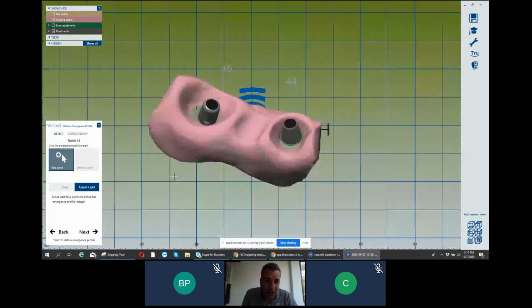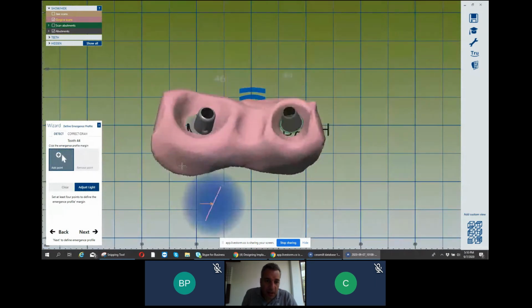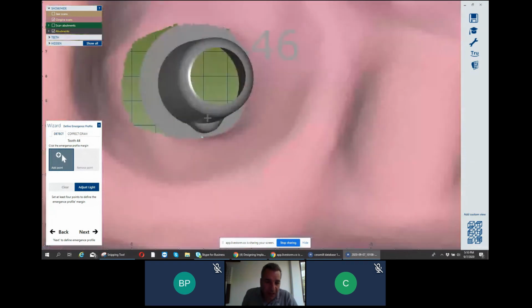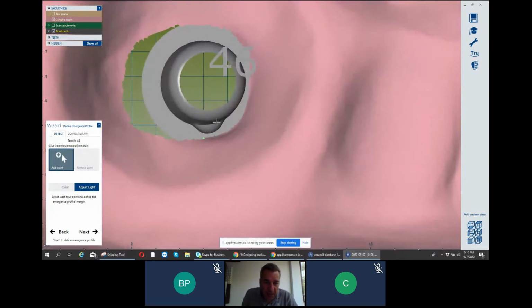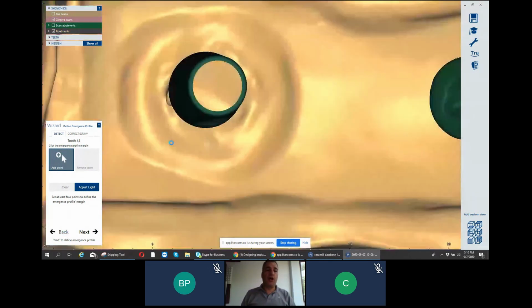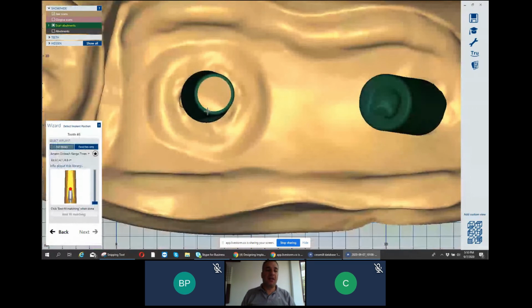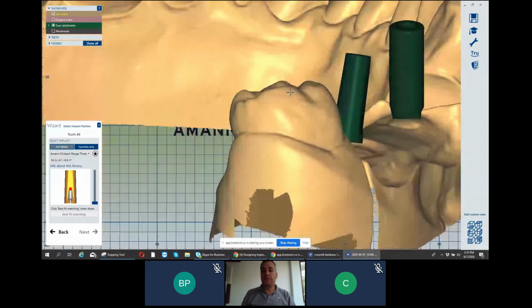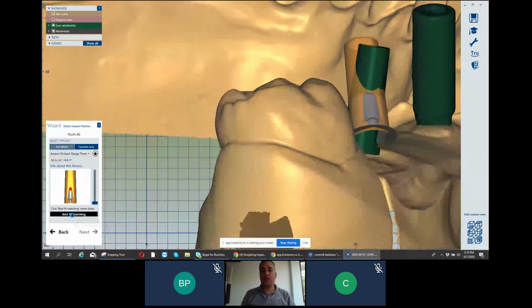So now we have the shape of the tie base. We have the tie connect normal one. You see there is a retention, it's buccal. That's why if by mistake you choose it wrong, you didn't place the red dot buccal, you place it like this here, and you click best fit match, it will not be the right position without clicking control.